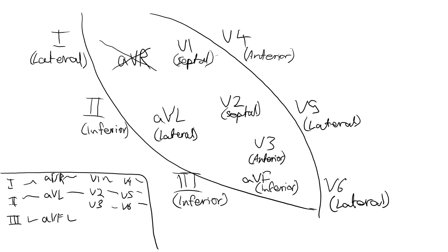So in review, we quickly looked at the ECG trace and how to calculate the heart rate as well as any changes in rhythm as well as a sinus rhythm that are occurring. And by a visual representation of the heart, we were also able to look at how an ST elevation on a heart is represented in terms of a myocardial infarction organically on a heart. So I hope all of that made sense today.